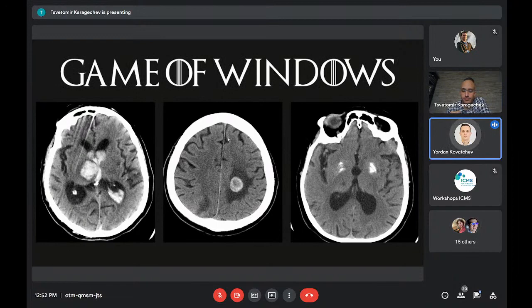So just to add, probably the intraparenchymal hemorrhage ruptured into the ventricles, right? Yeah, exactly. On this slice, you can see it really well on the left. That's where it probably ruptured. Exactly, this is important. When intraparenchymal hemorrhages occur in close contact to the ventricular system, they can rupture into the ventricles, and inside the ventricular system, it can cause obstruction.